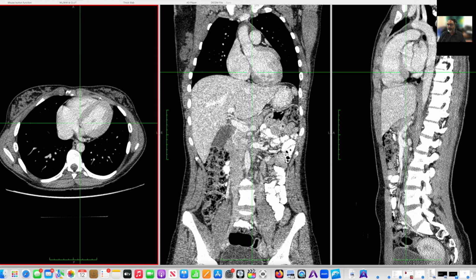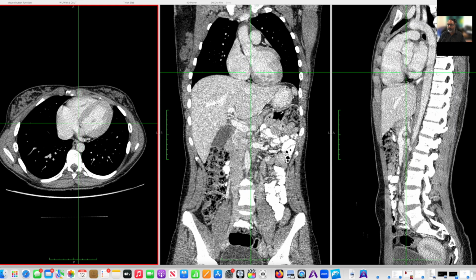Here you can also see the pericardium around these structures, and you can see some pericardial windows. The pericardium is an important structure that you should be able to visualize, as long as you know it's around the border of the heart, because you get pericardial effusions and sometimes edema and fluid in that area. You should just know where that is. You do know where it is, but on a CT, it's been demonstrated to you.